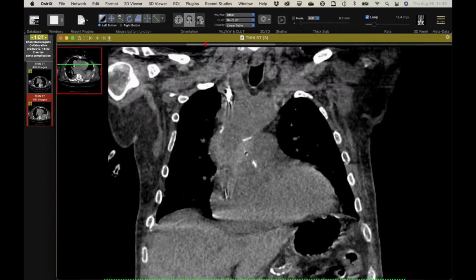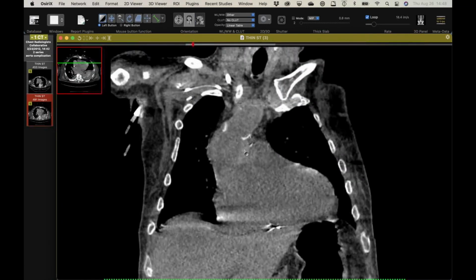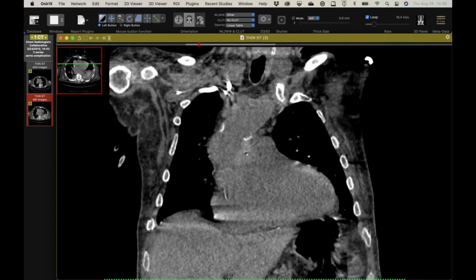Has anyone ever seen this? I can't prove it's blood and not some kind of protein reaction, but it looks like blood. Has anybody ever seen this kind of delayed, whether it's a transplant or not, but sort of periaortic graft leak?